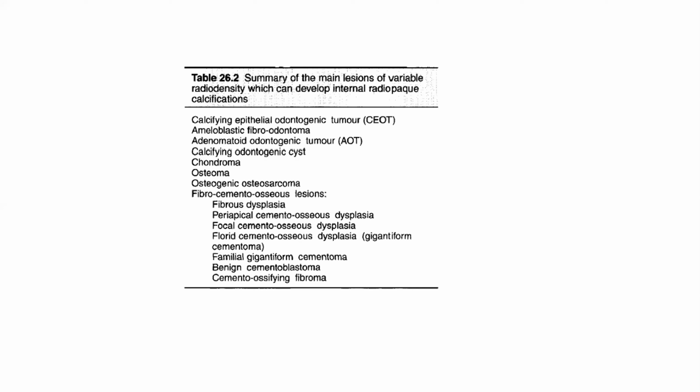I'm going to give you a hint: you're actually doing the implant course, so maybe you get a hint why fibroosseous lesions are very important for us to identify. Cancer detection, maybe? What does cancer have to do with it?